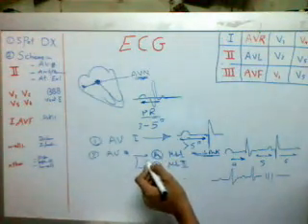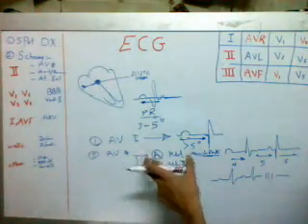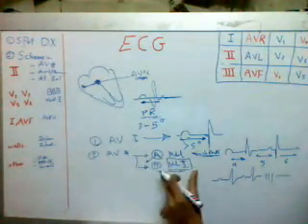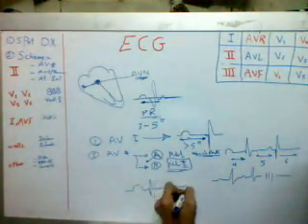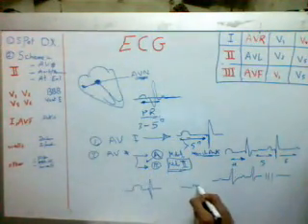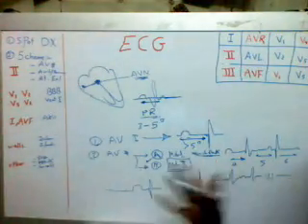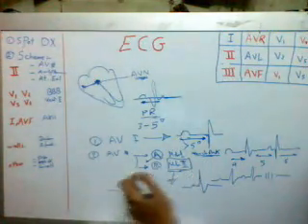This is called Mobitz type 1 of the AV block, second degree. Mobitz type 2 is dangerous. In Mobitz type 2 you see the P wave, QRS complex, and suddenly a loss of the beat. There is a loss, then the others. This loss comes suddenly, not regularly like Wenckebach, just a sudden loss of the beat. This is called Mobitz type 2.